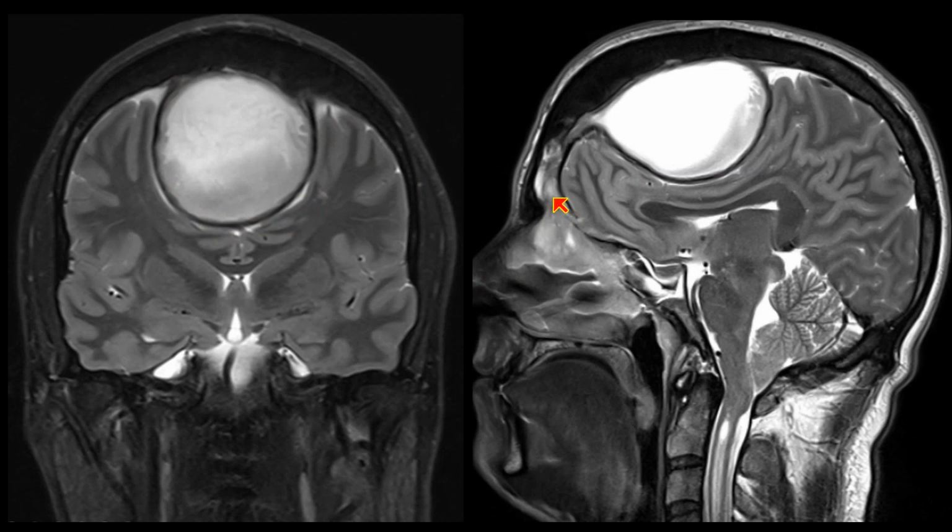This patient actually had a frontal sinus mucocele that had gone intracranial and caused a giant, impressive intracranial abscess that was so big and had so much mass effect on the brain, it was causing herniation at the foramen magnum, and this patient had a syrinx.